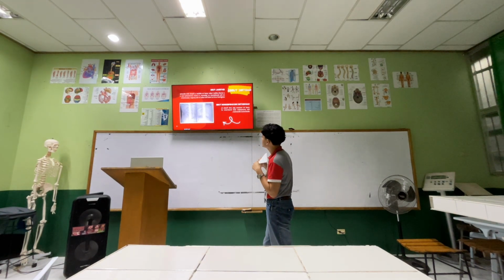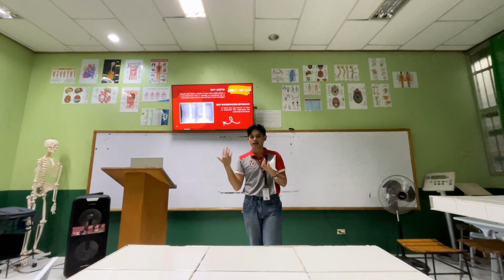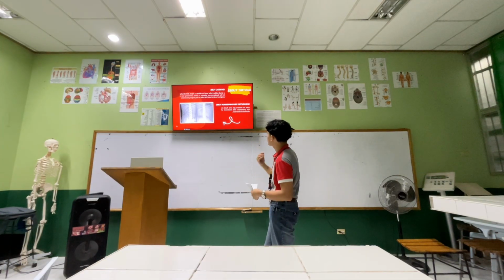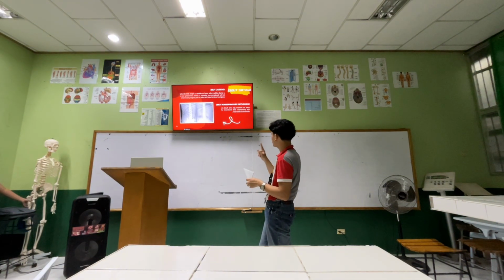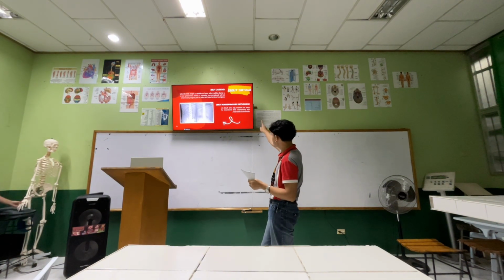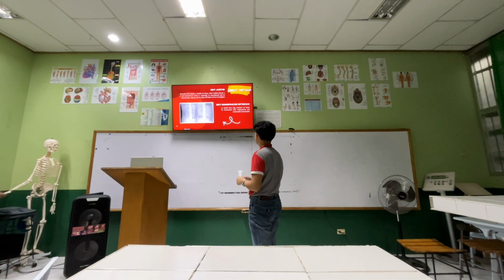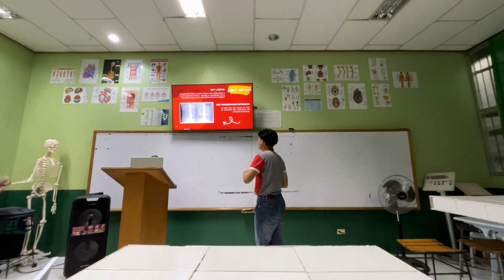Okay, we have the enteral tube, a small caliber tube used to deliver a liquid diet. So this is part of those used to deliver nutrition to our body directly to the duodenum and jejunum. It most commonly has a weighted end to hold the tube in the proper placement. Next is the nasogastric decompression tube used to remove gas and fluids in the prevention and treatment of abdominal distension.